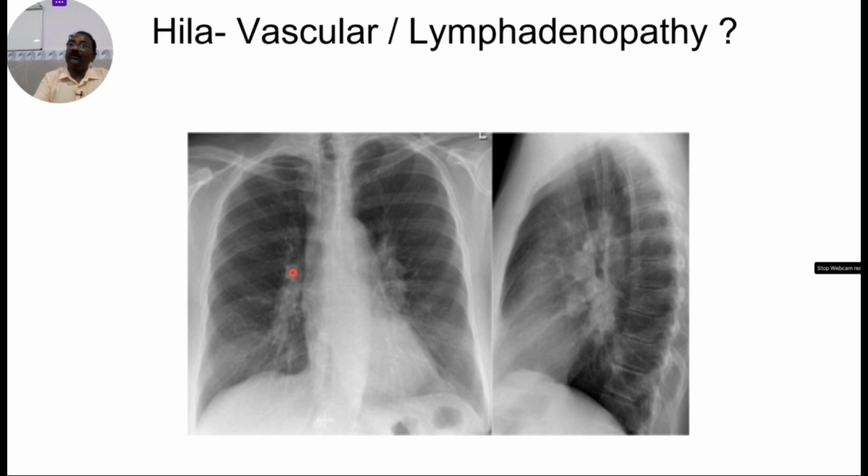So you are not in doubt. So get the lateral film. Get the lateral film. So in the lateral film, what are you seeing? Good. So these are all the different nodes. So it is not vascular, but it is lymph node. See how nicely you can differentiate.